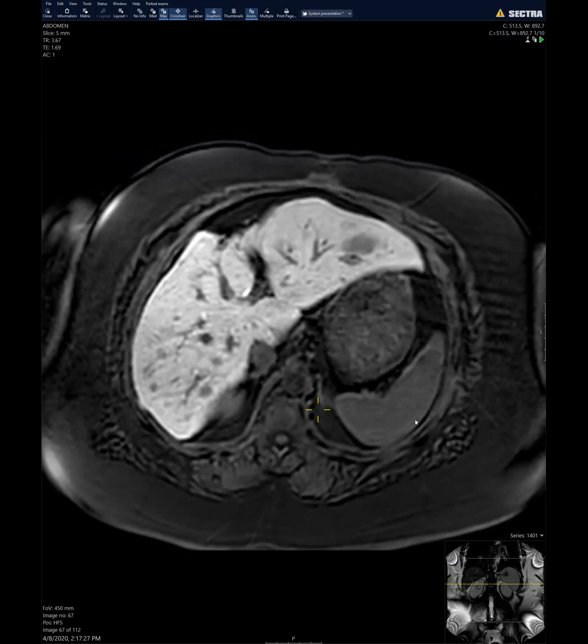Yeah, so a couple of points here. This is actually more of a wash-in of the liver than washout of the lesion. So yes, it helps that way. And the other thing is that when you look at the EOVIST scan, that typically is very close to the opposed phase echo time. So when you're looking at fatty infiltration, like your last case, Gitanjali, that basically had some dropout because you are very close to the opposed phase imaging.